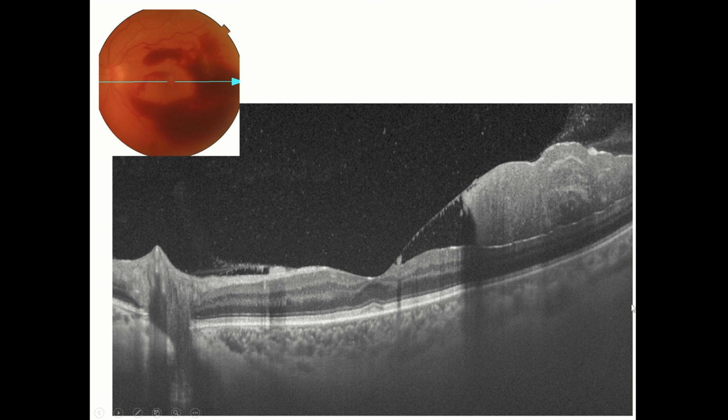So this patient would definitely need a hyaloidotomy with a YAG laser, or the other option is to go inside and do a vitrectomy, remove that vitreous and release that hemorrhage, and then later on wash that out.